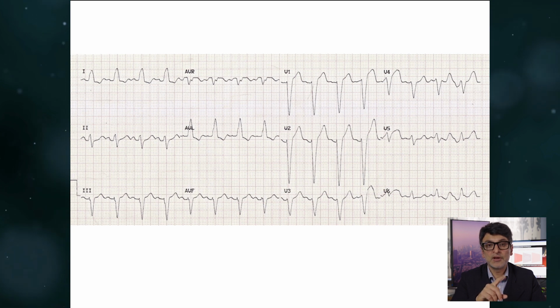So the take-home point here is, to call anything a bundle branch block, the key criteria is that you must have a broad QRS. You can't call something bundle branch block if their QRS duration is narrow. So to call something either left or right bundle branch block, it is absolutely critical to confirm that they've got a QRS duration that is broad, so that's more than 3 small squares. And the way I'd do it is look at the QRS duration at the top of the ECG, if it's more than 120 milliseconds. Once you've done that, you know you're halfway there. You've got bundle branch block. And you've just got to figure out, is this left bundle branch block or right bundle branch block?